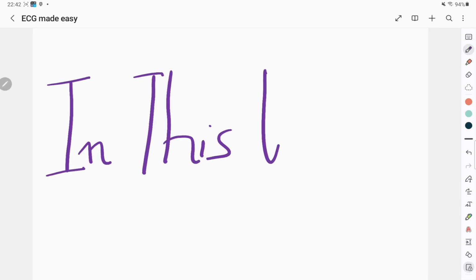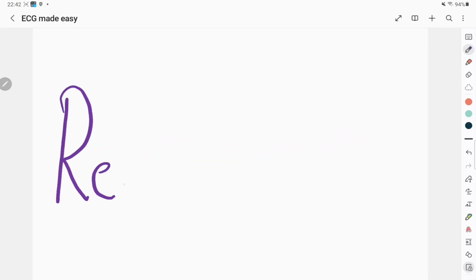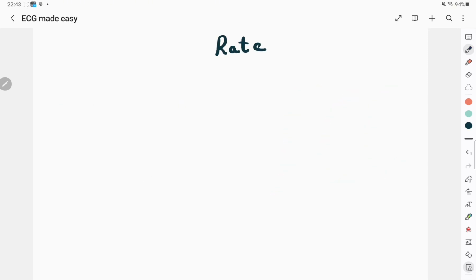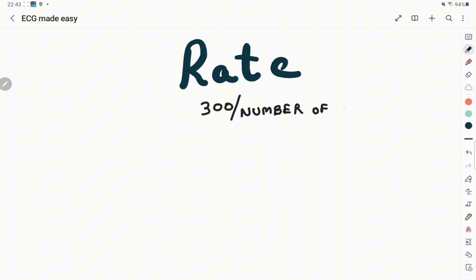In this video, I am going to show you how to read an ECG in an easy systematic way so that you don't miss common abnormalities seen in ED and the ward. Start by calculating the rate. It is done by dividing 300 by the number of large boxes between two R waves.